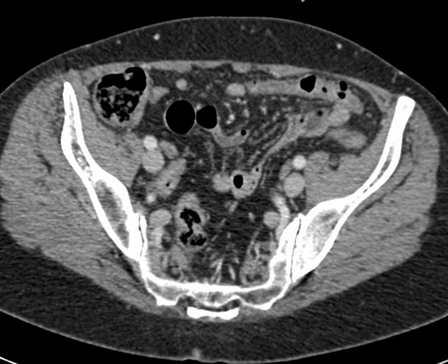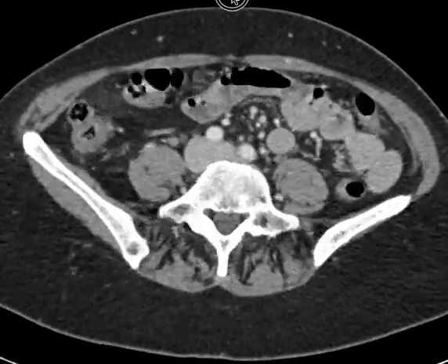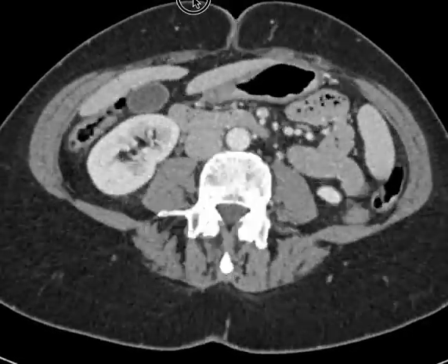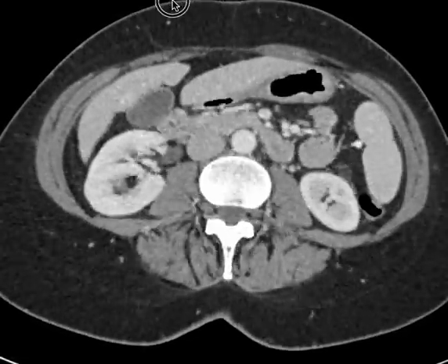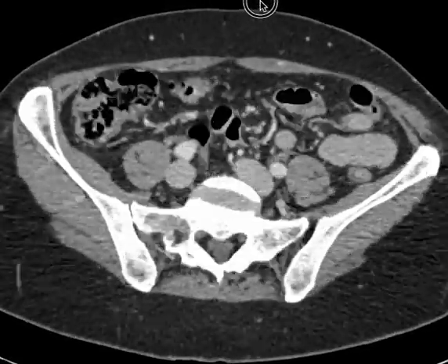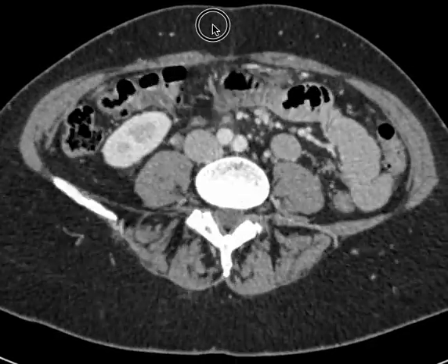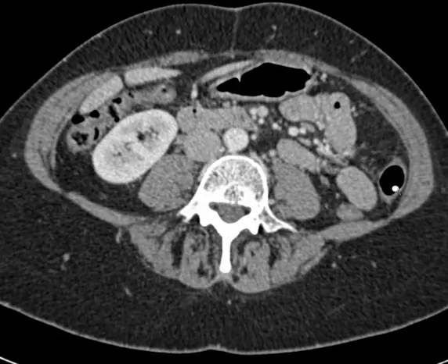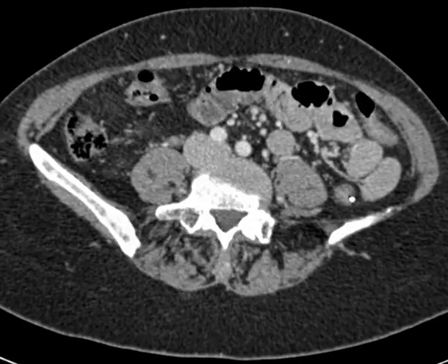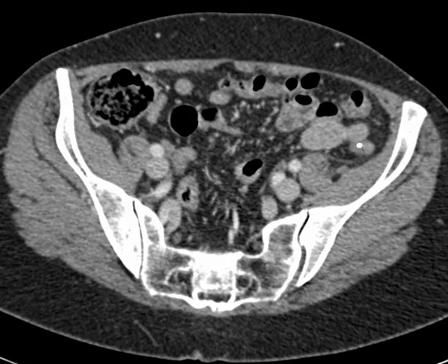So here's the beginning of the descending colon right here. Okay, you can see this. So here's that descending colon. And here's colon. Then the descending heading down. This one actually had quite a redundant transverse colon.